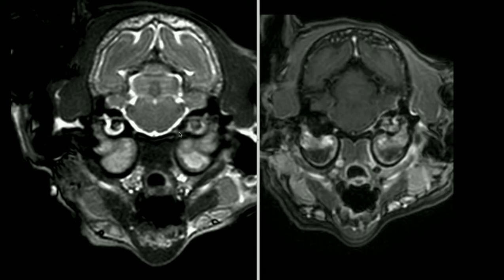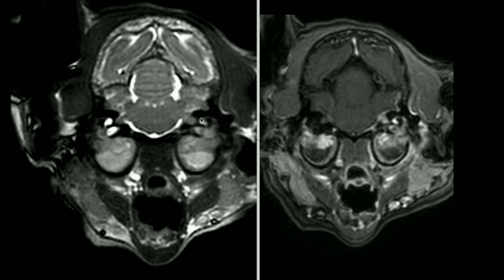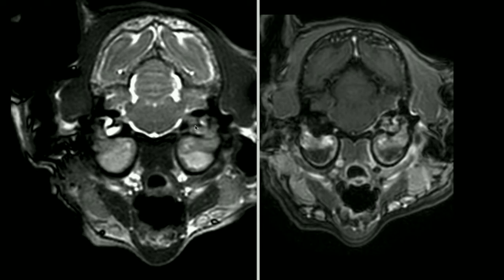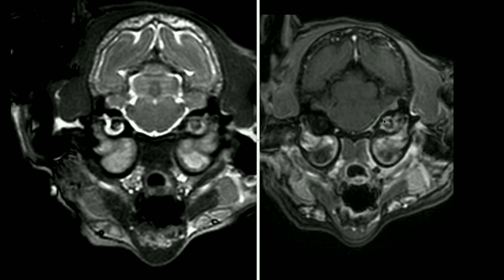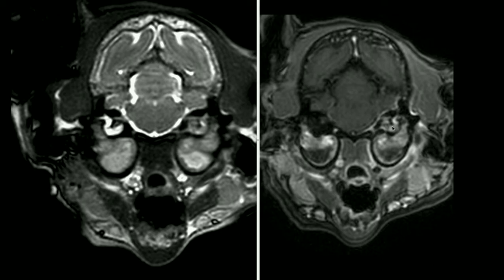Here we can see this abnormal signal in the inner ear on the left, and additionally, with the higher resolution, we can see that we also have thickening of the proximal part of the left facial and vestibulocochlear nerve. Additionally, in this case, we have a high resolution 3D post-contrast image with fat saturation, and this is a fantastic sequence for assessment of cranial nerve disease. Here we can see additionally this very nice enhancement of the proximal part of the 7th and 8th cranial nerves, the meningeal enhancement, and also the abnormal enhancement of the inner and middle ear structures.